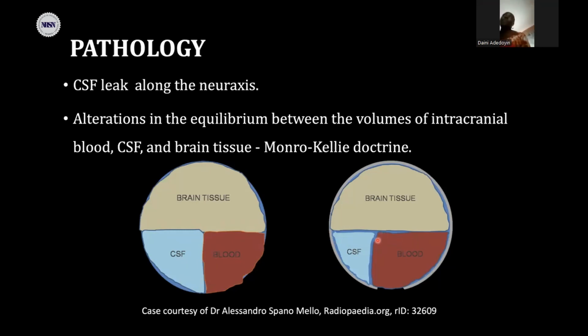So it's the blood vessels that tend to distend, and out of the arteries and the veins, it's going to be the veins that can cause distension. So in SIH, you have to look for venous distension. That's a compensatory mechanism to keep equilibrium.